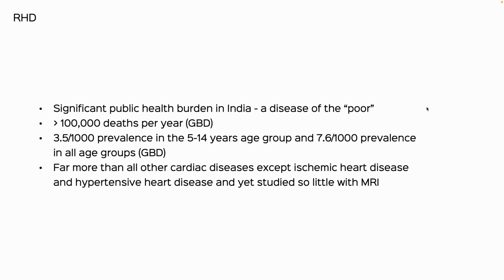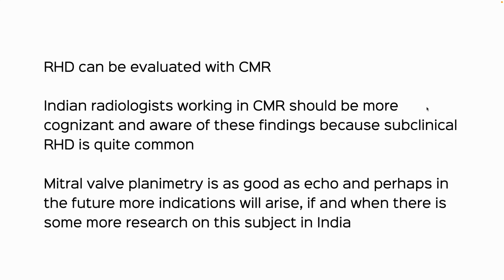It's the commonest cardiac disease in India, except ischemic heart disease and hypertensive heart disease, and yet we know so much about IHD and HHD even in India, but we know so little about rheumatic heart disease and MRI, and it is the commonest cause of valvular heart disease. And so, remember, even planimetry is as good as echo, and perhaps in the future we'll know more about why CMR would be useful in such patients.